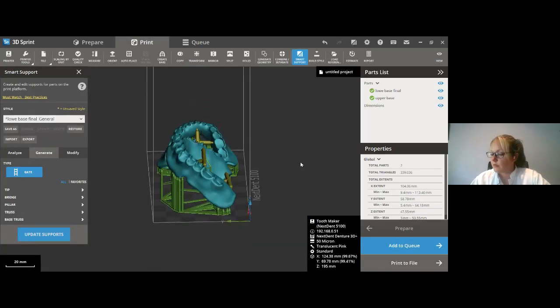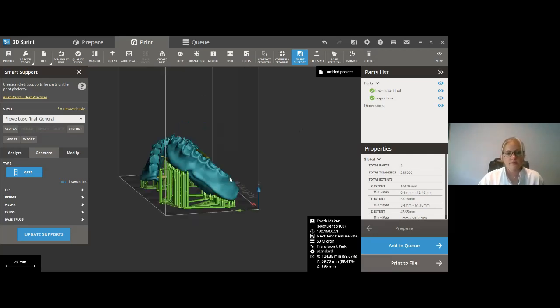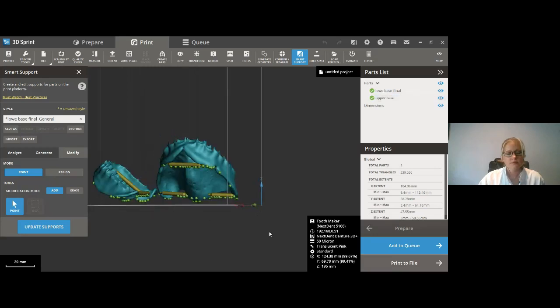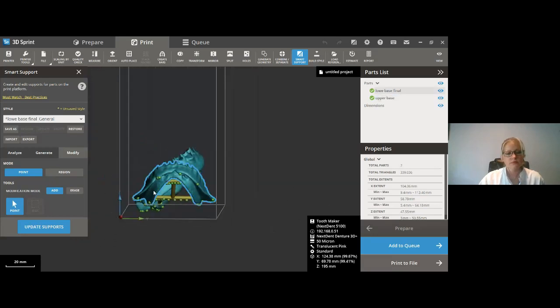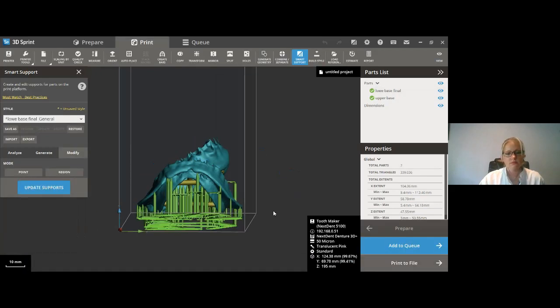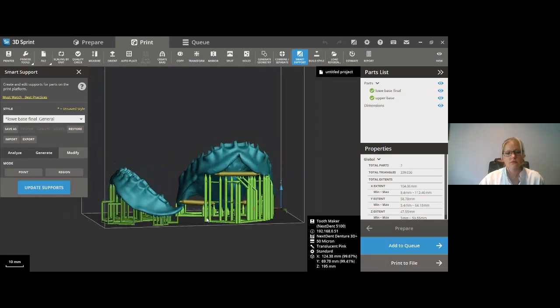Yes, Adrienne, and while we're looking at the support generation, I also want to add that currently there is a new support style in the making, also slightly improving the stability of the build. This didn't completely make this update yet, but it will be made available through these automatic database patches soon. So we're talking about 1 to 2 weeks from now. This support will slightly increase the number of anchor points, but mainly there is a change in the trusses. That means the connections in between these support pillars are a little bit more stable, so they provide a slightly better pillar.